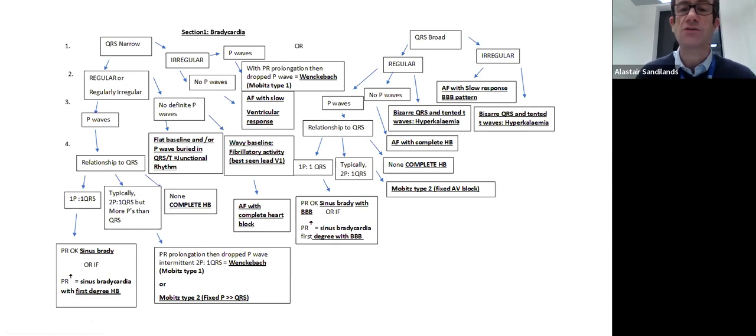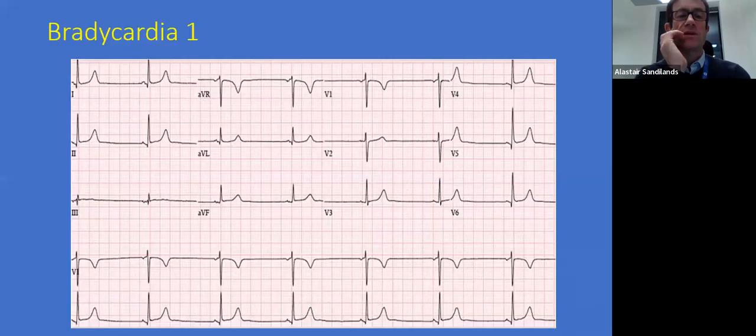Any questions about the algorithm? Okay, so let's go through some examples then. You want to use the algorithm in practice. I'll just give you some time to look at the ECG and then we'll walk and talk through all the examples.